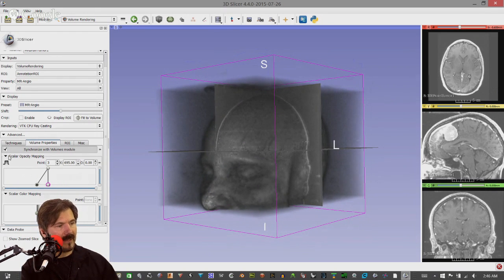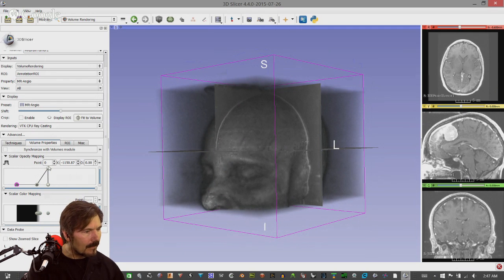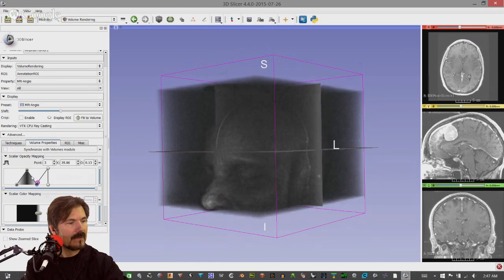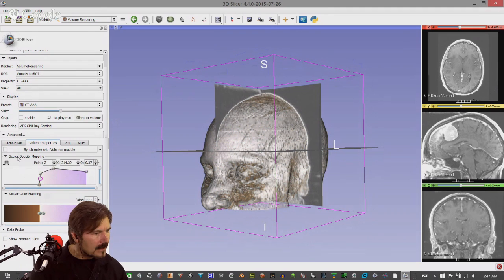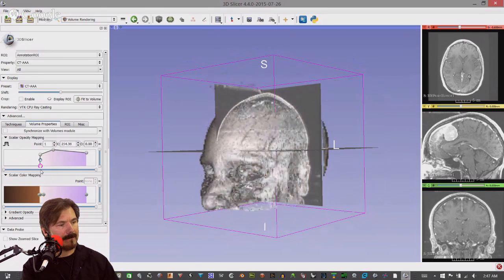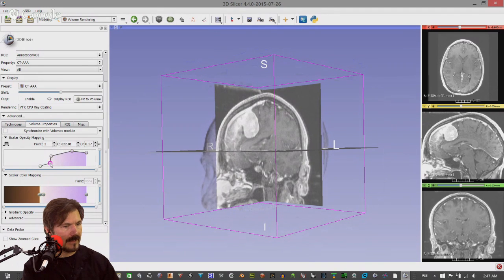And then we can go over here and start tweaking. I actually have to switch it off now. But now we can go in and start tweaking our threshold levels. And we can delete or create new spots, but it's not cooperating with me. So let me go back up here. There we go. And then start with a pre. But notice if I start moving these around, I can actually vary. See how I'm changing the color? If I do this, see how I just modified it into a big block? But if I go in this direction, there we go. Notice how it's becoming transparent because I've modified the threshold levels.